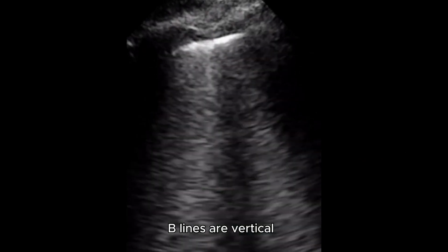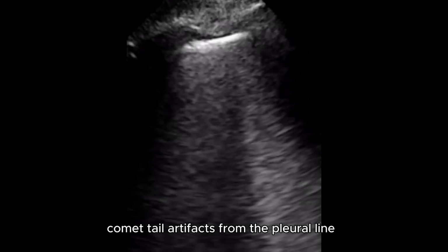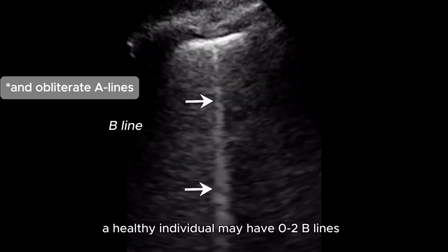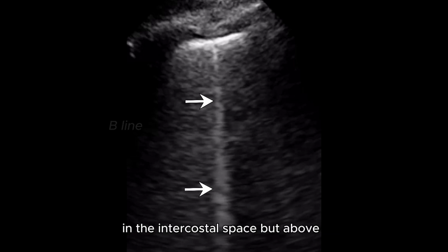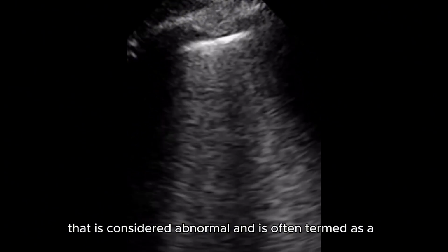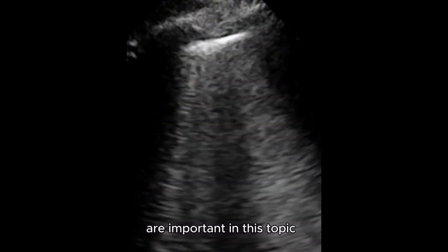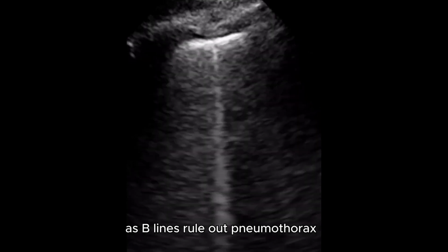B lines are vertical comet-tail artifacts from the pleural line. They appear like a flash of light extending down. A healthy individual may have 0 to 2 B lines in the intercostal space, but above that is considered abnormal and is often termed a lung rocket. B lines, however, are important in this topic as B lines rule out pneumothorax.